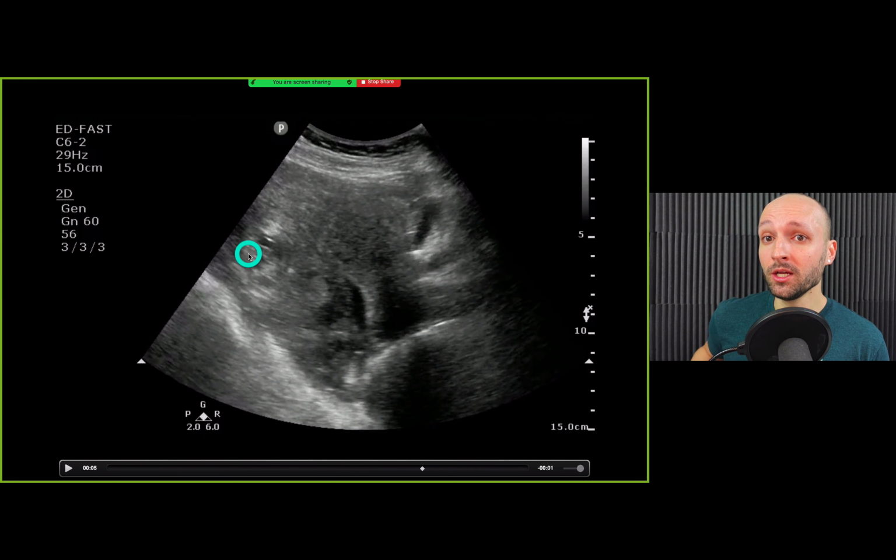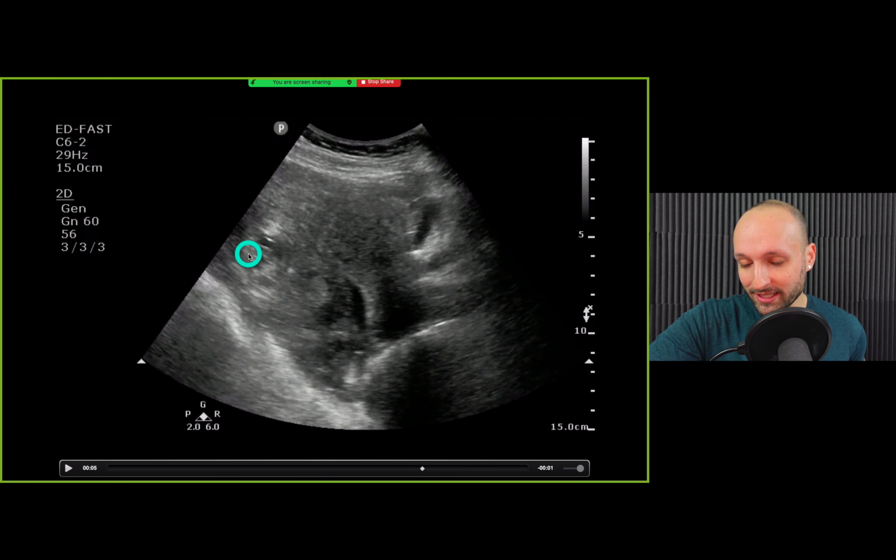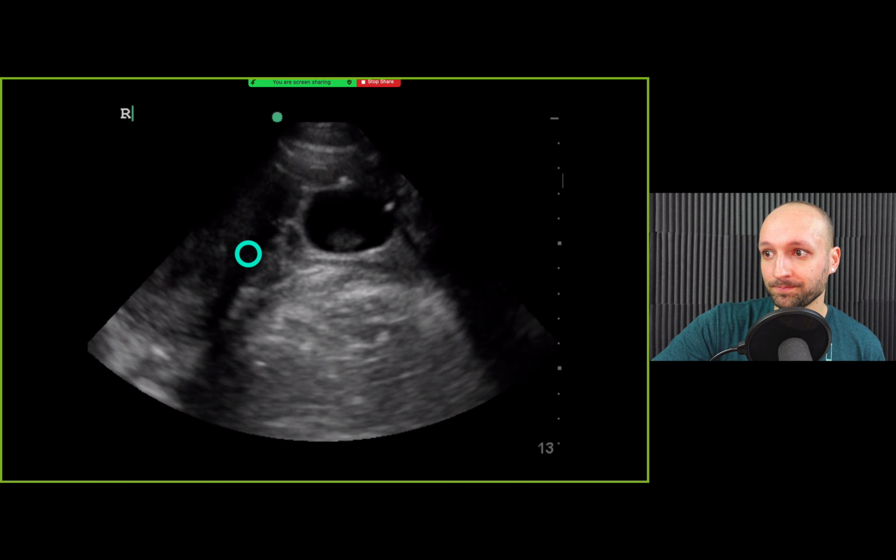If you see clot, especially free fluid in the right upper quadrant with a positive pregnancy test, you don't need to get a radiology performed ultrasound. You don't need to get anything else. This patient needs to go to the OR with our OB/GYN colleagues. These are situations in which, if you show them the image, they will say, okay, you're right, and they'll take them up. So don't hesitate on these patients with acute abdominal pain with suspected ruptured ectopic. Don't hesitate to contact your local OB/GYN physician.